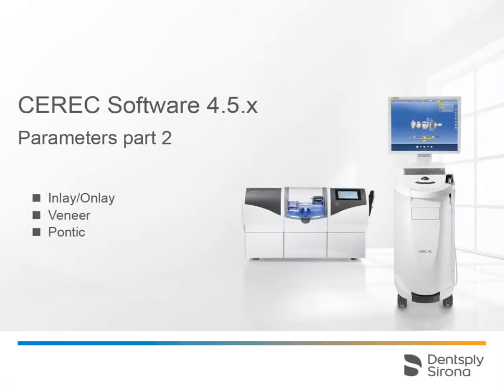Welcome to this video tutorial on the topic of parameters, Part 2. This video will show you how to define the parameters for inlays, onlays, veneers, and pontics.